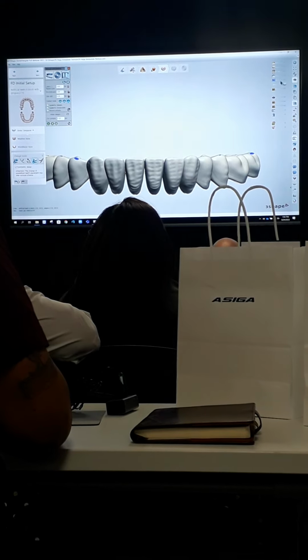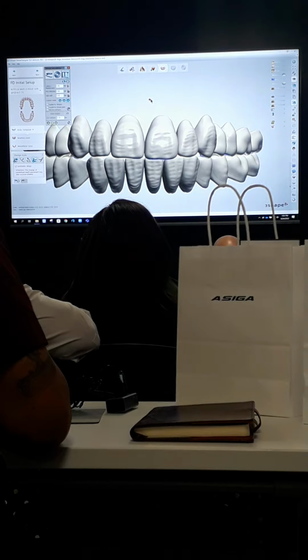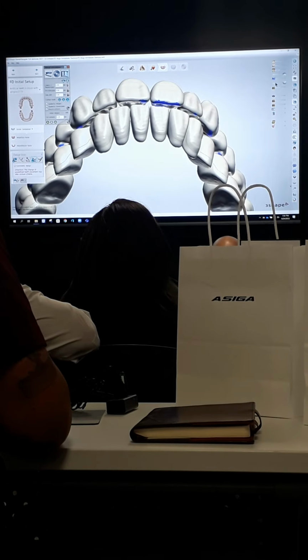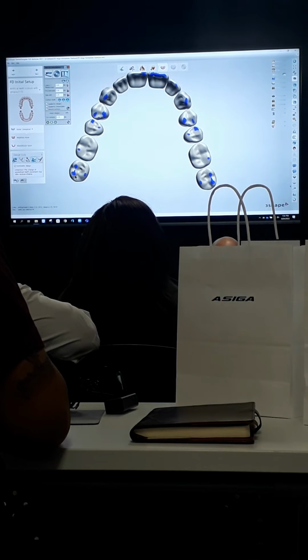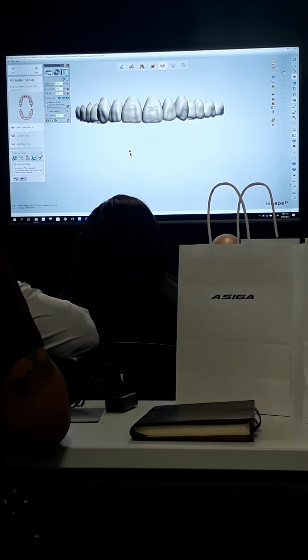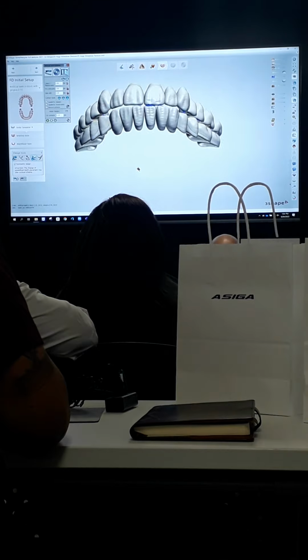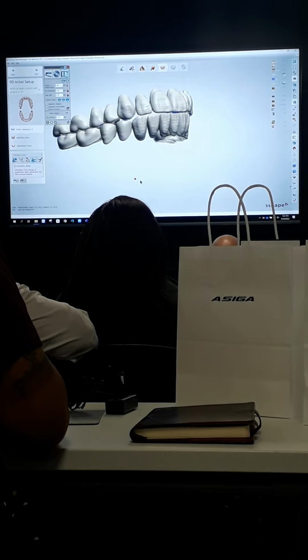And then if I rerun the articulator, it'll show me what it looks like now with the new function. So now if I turn off the lowers, my markings are starting to get a little darker. So something there in the anterior is causing an issue. It could be the canines as well. So you can also look at the functions individually with this as well. Not a lot of people know this, so I'm going to show it.